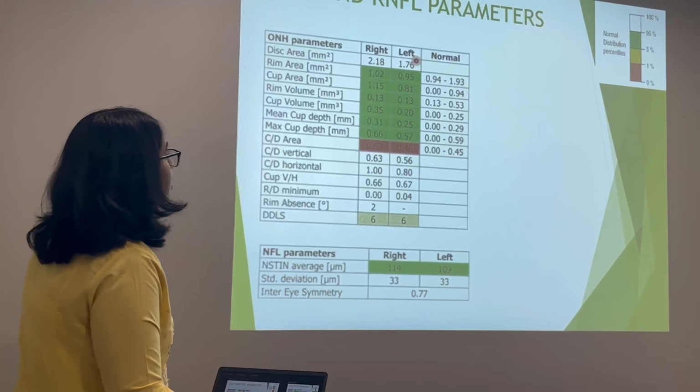Then the graphical plot. The RNFL graphical plot is also color coded, with green normal, and yellow and red danger zones. Then we follow the line and see if it dips into the red areas. Here it is just borderline in the right eye, in the superior RNFL area, but all others are within normal limits.